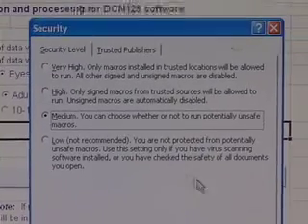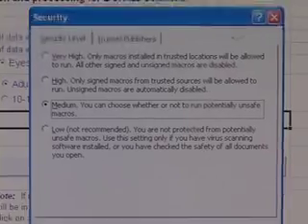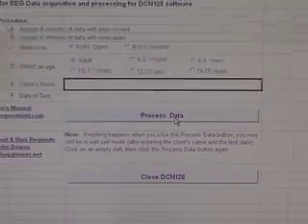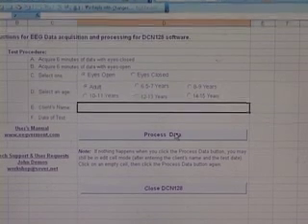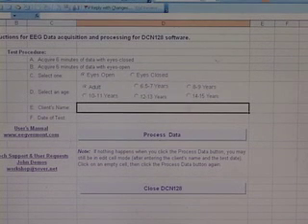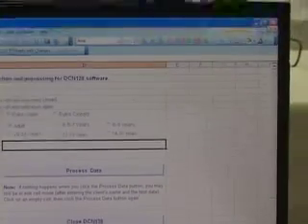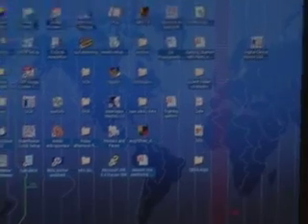Okay, now that we've done that, I'm going to click OK. It's a little bit lower in the screen. There it is. And now my software is ready to work. Except what we need now is some data, don't we? So what I'm going to do is encourage you, at this particular moment, to X out my software. Just X it out. Okay? And let's go back to BrainMaster.